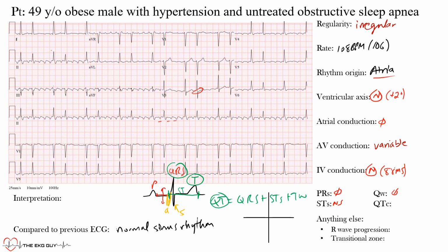The QTc corrects for heart rate, and we tend to use it because it's more clinically helpful. In this case, the QTc interval, correcting for heart rate, was 401 milliseconds, which in male adults is normal. Less than 440 tends to be okay. Not until it's around 500 milliseconds does it start to shift our focus and thought process, at least up in that upper range.